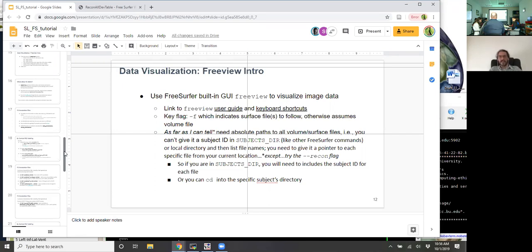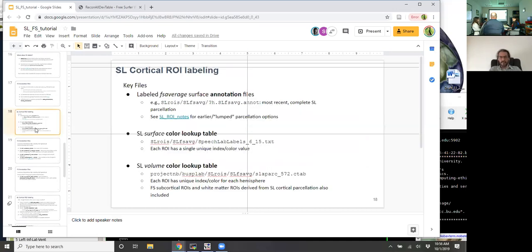Great. With the same name, so we could look into that. But you'd still have to know to link the files. We haven't really done that because we've kind of kept the same one around. But I can look into that.